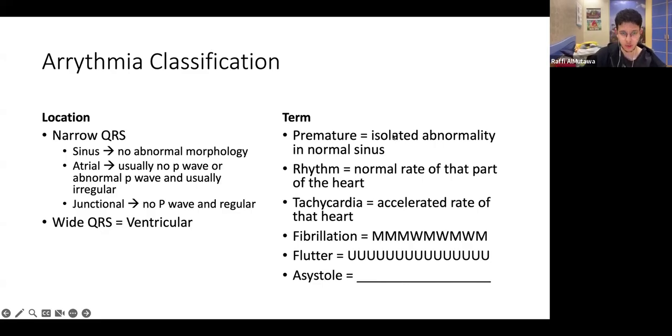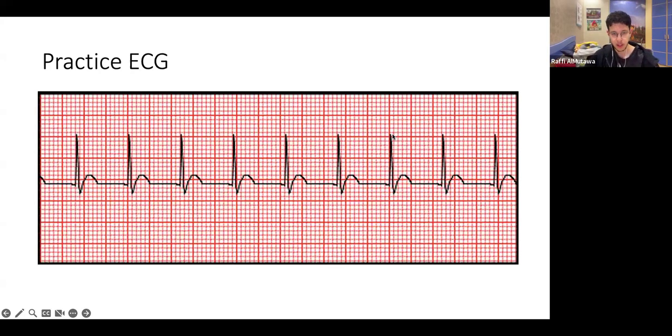So let's resume. Now we have a practice here. Can anyone tell me what this is? Okay, now they're thinking.